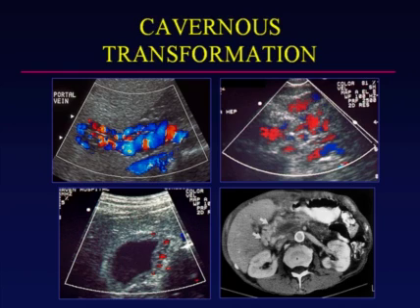The findings on Doppler ultrasound are characteristic, and you see this spaghetti type appearance of red and blue flow within these varices, a thick vascular gallbladder wall with tortuous vessels within it, and here you see a confirmation of this finding, these dilated vessels in the porta hepatis on the CT scan of this patient with cavernous transformation of the portal vein.